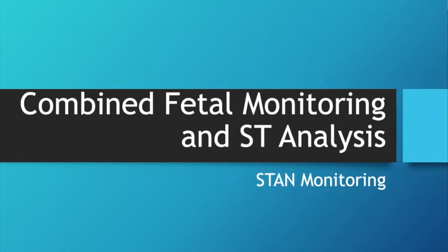And that statement is very, very important, because if we are not muddled up, if we think that this baby is not hypoxic, we should not get alarmed or confused by ST messages. Okay.